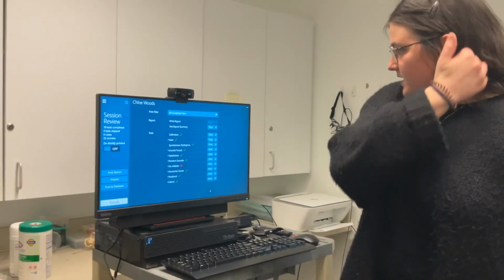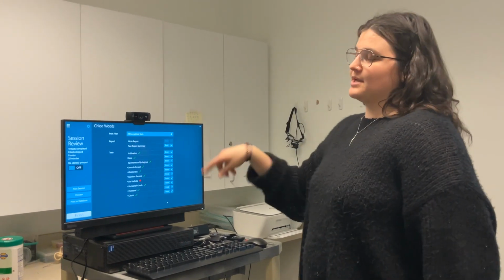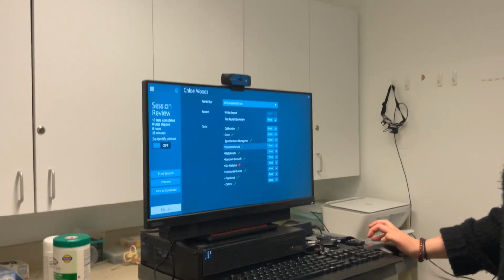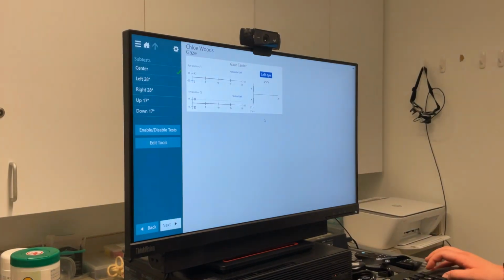Okay guys, so you have finished all of your VNG lab protocol. You click next, and it brings you to this screen. Before you hit finish, it's now the time that you go in and analyze. So we'll start with gaze.